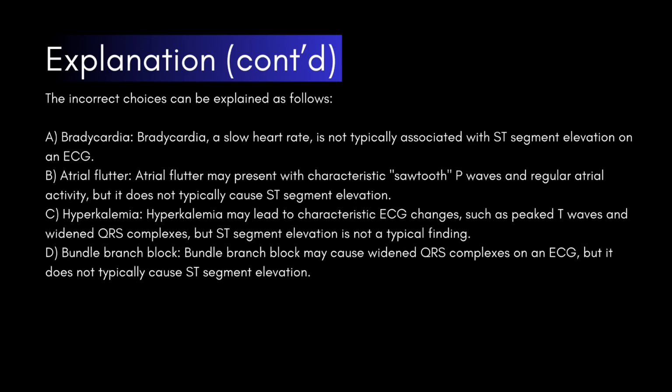Bundle branch block. Bundle branch block may cause widened QRS complexes on an ECG, but it does not typically cause ST segment elevation. Guys, that will do it all for the content today.